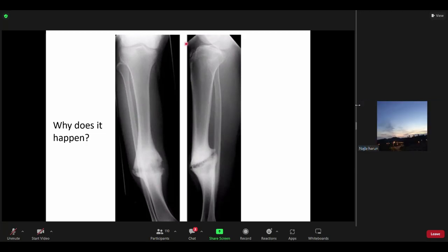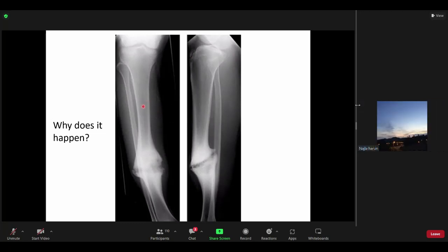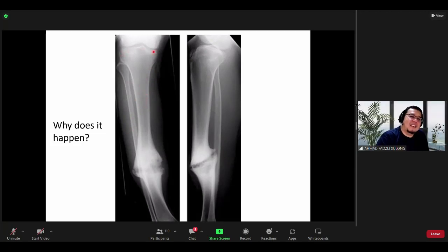Basically, on lateral, kita nampak 2 joint. Yeah, you should see 2 joints. But now you can see 1 joint. So is that joint AP or lateral now? From the anatomy, I think it is an AP view. When you see the knee joint macam ni, you can see the tibial plateau nicely, you can see the tibial spine nicely, so it's AP lah. This is a lateral. You should know how the knee joint looks on AP and lateral, okay? So this is AP, right?